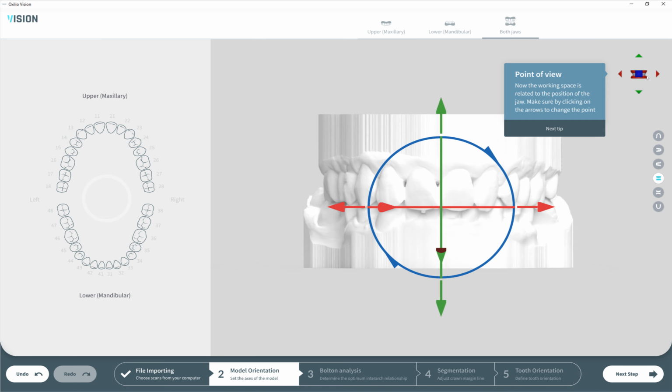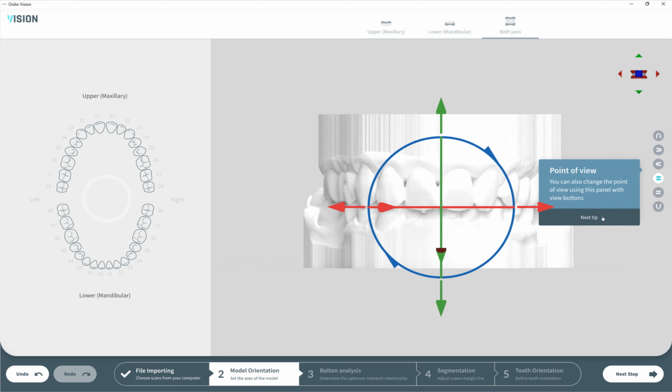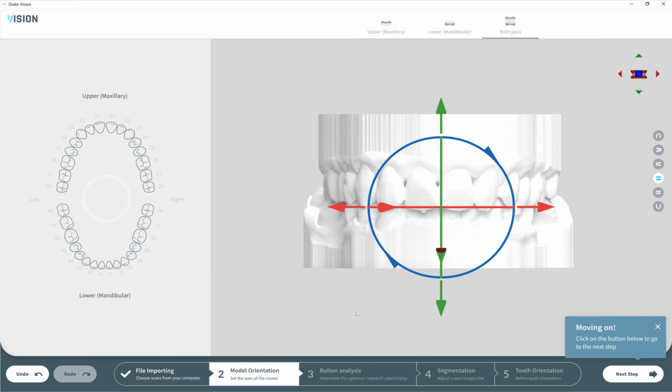Upper we are seeing a navigator. The design of it will be slightly changed later, and we continue to see some tips with some guides and help on how to navigate it. So the second step is complete.